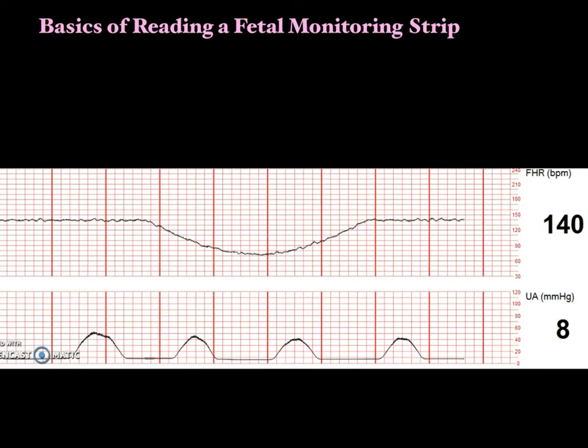Let me see if I can find that up here. Okay, so I didn't find a strip that had bradycardia, but if you had a fetal heart rate longer than 10 minutes that was less than 110 beats per minute, that would be a bradycardic strip. And unless you have some reason for that, if that's where that baby has lived forever, I know of one case, and it made us very uncomfortable.